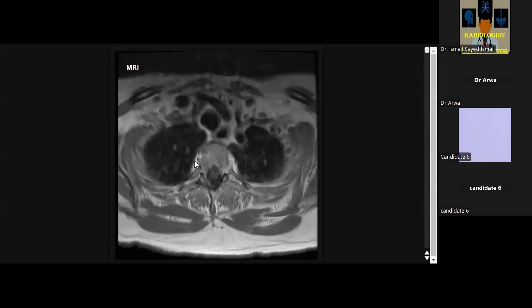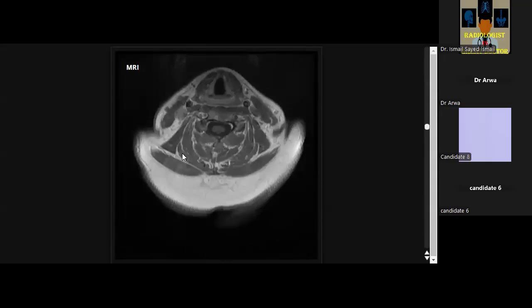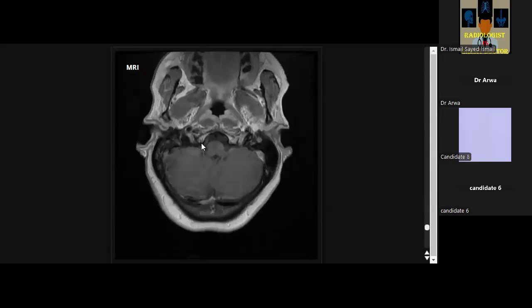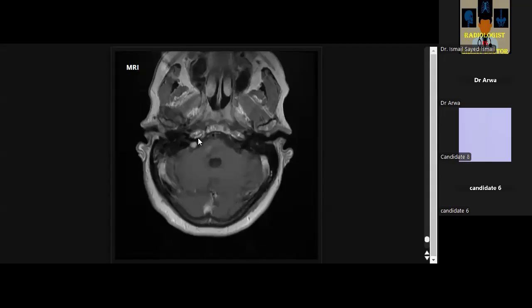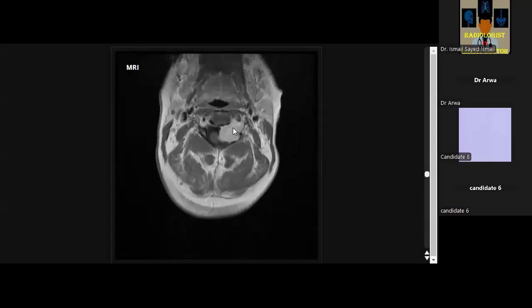Very good. So please, my friends, remember again, this exam is a little bit tricky. Film edge, the last cut. 99% of us will get this. It's very easy, but this is a trick. Very small enhancing lesion centered on the internal auditory canal. It's acoustic schwannoma. Together with the cervical schwannoma, diagnosis of a syndrome is made: NF2.